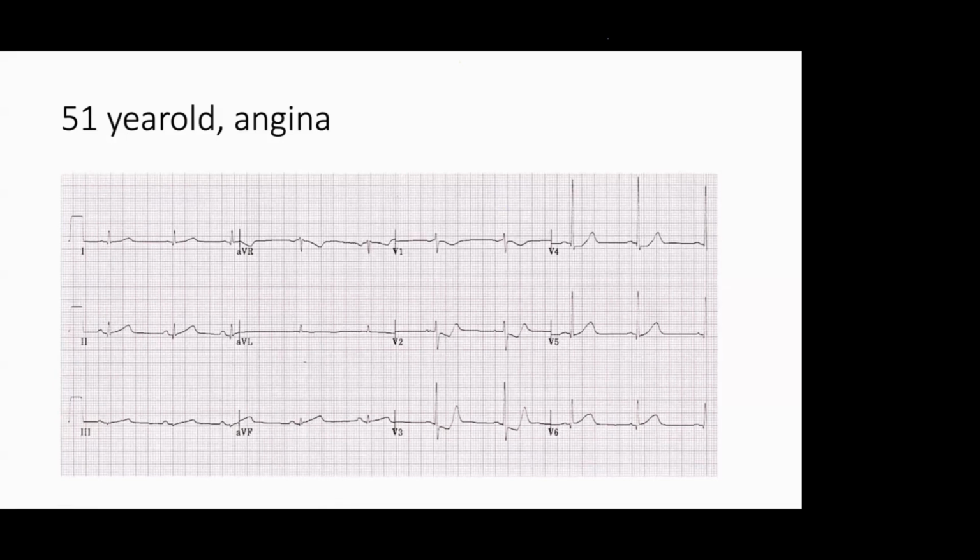So if you keep a lead at the back of the heart only, you will pick up ST elevation. So you see V7, V9 leads, you will see ST elevation, but V1, V2 leads see only ST depression and some ST elevation in the inferior leads also. So this is a true posterior MI. This is ST elevation MI, needs emergency primary PCI for revascularization.